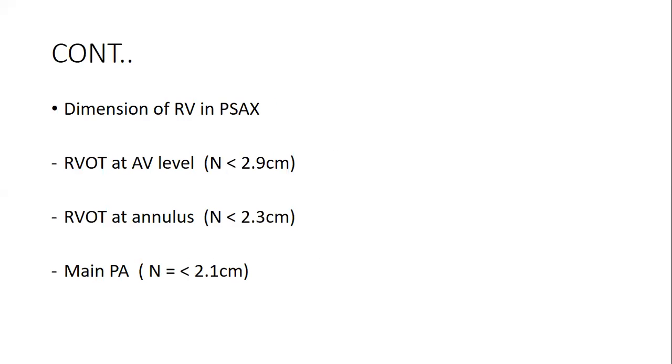You can also use the right ventricle in the short parasternal axis. I'm just trying to give another view that can also help you to say, am I really seeing what I'm seeing? So you also go in your short parasternal axis and quantify your measurements against the other parameters you took.